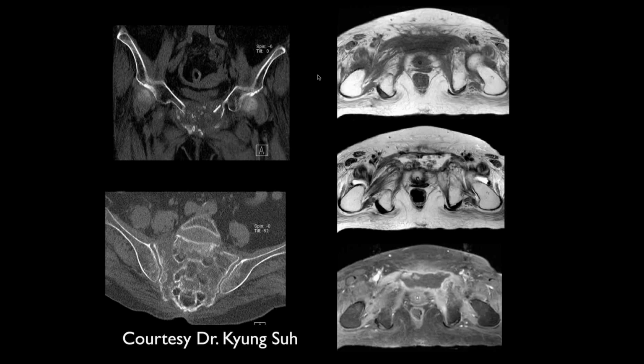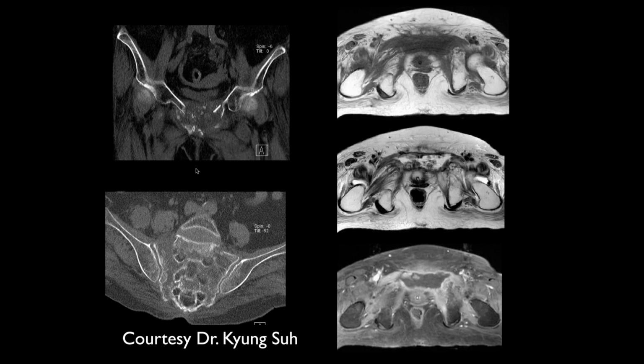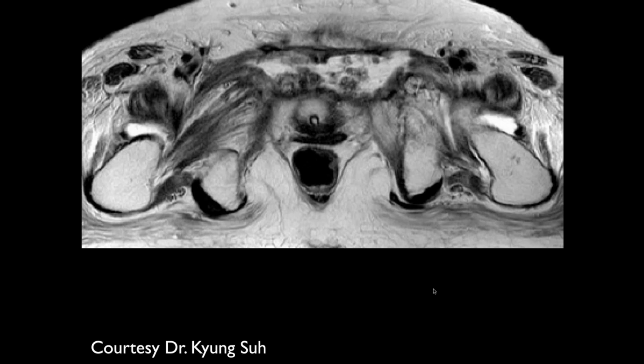So this was a patient who actually presented with osteoporosis, a chronic large fracture of the symphysis pubis region, and also in the iliac and inferior pubic rami, also bilateral stress fractures involving the sacrum back through here, and then this got infected, and that's what you were looking at there. This is actually a secondary infection with an abscess.